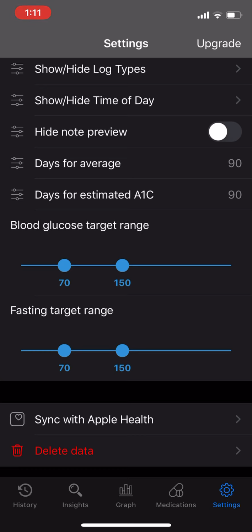So for the purpose of the app, it seems like the purpose is to just help people with diabetes better manage their blood sugar by providing an app that helps them track their blood sugar daily, and also provides them with additional insights and graphs and an A1C estimation with the plus feature.